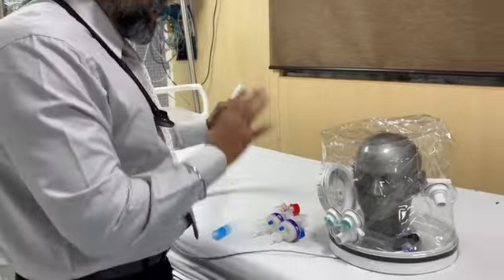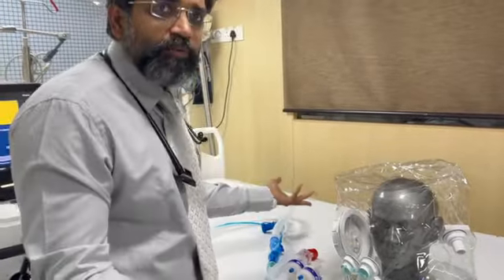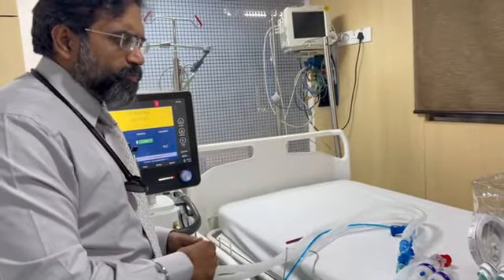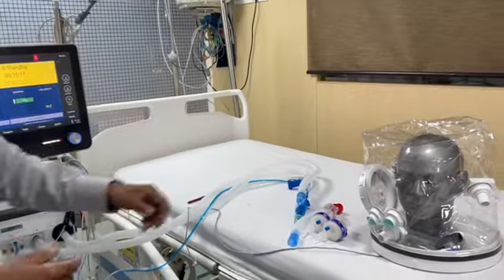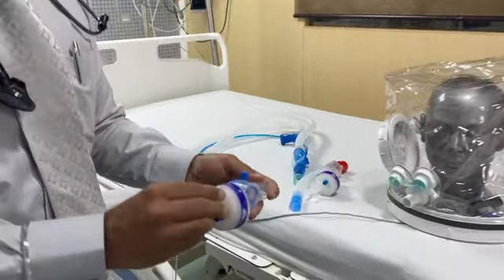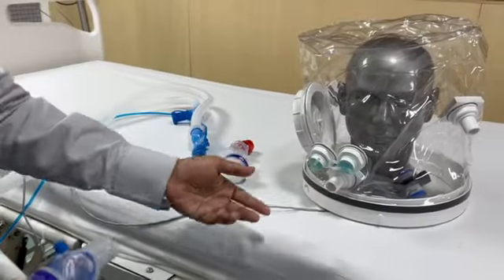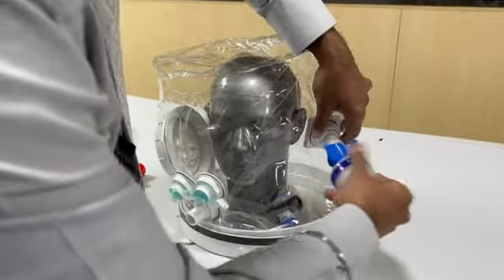You have the non-invasive mode on this ventilator, and if I'm going to use the helmet with this particular ventilator, I just need one port. I don't need these extra ports. They're really not required. So we can block both of these ports with whatever blocker you want. Here we have used a blocker, a device that does nothing but block. I can even block it with tape if I want. So I'm going to block the port over here, completely.